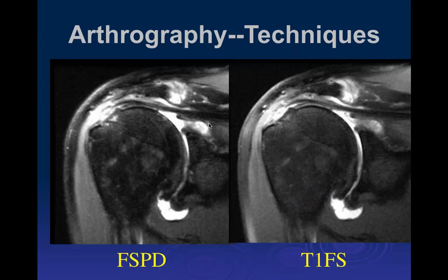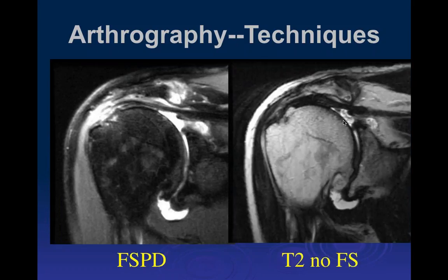And on the T1, this just shows a difference in contrast between the PD FatSat and the T1 FatSat. Not a lot of difference. If we go to the T2, what we see here is actually fibrous tissue through here, and it absorbs the contrast. But what we're dealing with here is a full thickness tear that's retracted. Then we have scar in situ that's developed out here. So there's retraction of the musculotendinous junction. There's an inferior surface tear that's retracted more than the body of the supraspinatus tendon. And this is torn here, but this is now scarred in with scar in situ.